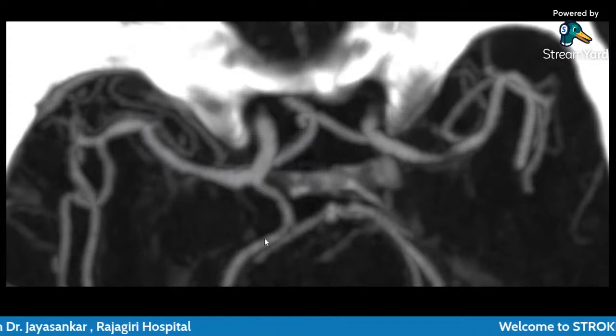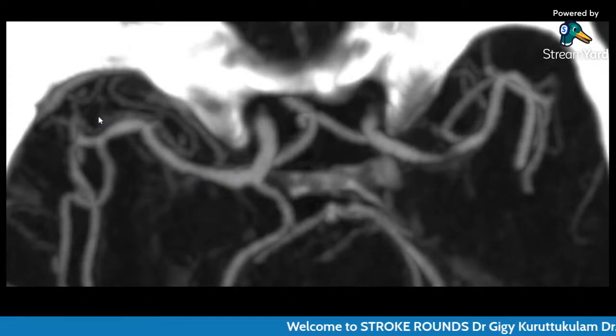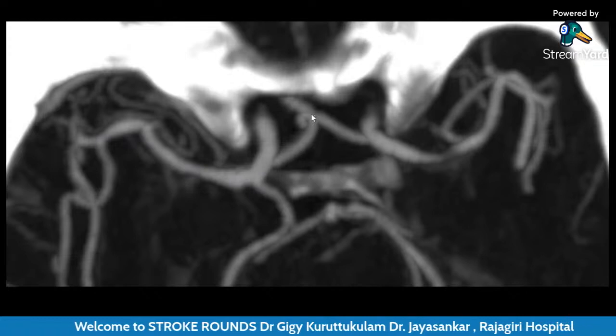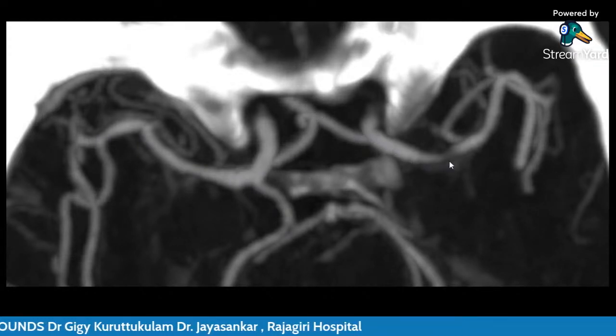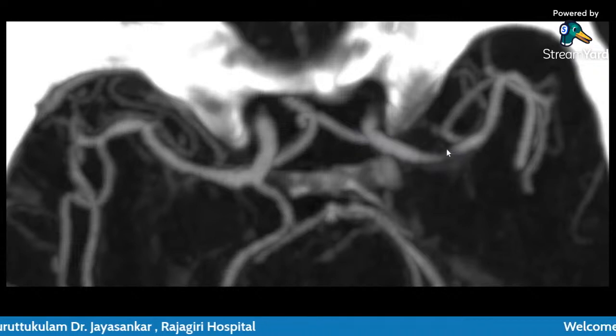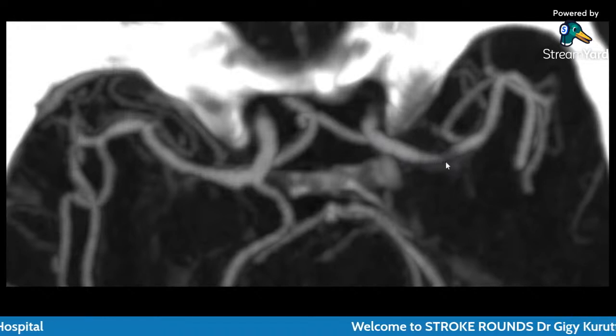We can see the very large PCOM continuing as a PCA. This is the M1 dividing into two branches. There is nothing significant on this. This is the ACA. So on the left side, we can see an almost normal carotid with the MCA, and there is a filling defect in almost the mid portion of the left M1 segment.